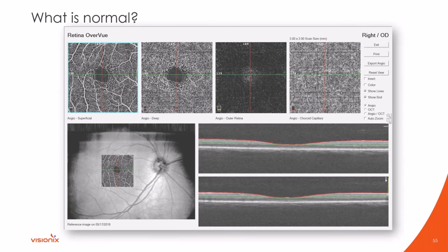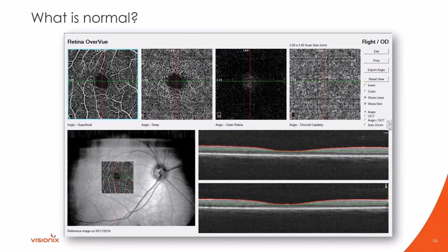This is a very, very normal OCT angiography of a healthy 25-year-old optometry student. And you'll notice when you take a look at this, I'm going to call your attention that we have no numbers here. This is qualitative data. It's given us just wow pictures, especially these two on the left, just wow pictures of imaging that capillary network.